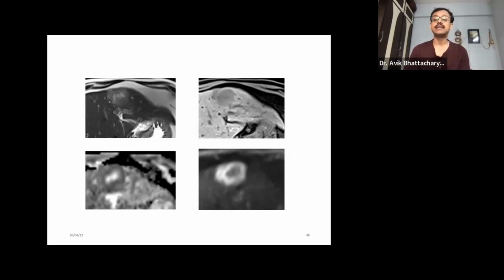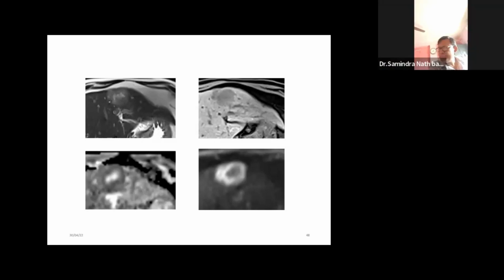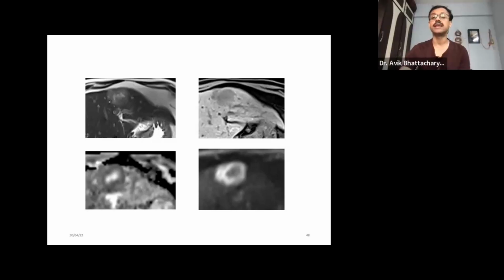Otherwise, the other stages of hepatic hydatid cyst would have different characteristic features. Like in CE1, it would have a well-defined wall, hydatid sand, dependent debris. In CE2, it would have multiple internal cystic lesions, daughter cysts. In CE3, there will be a detached curvilinear echogenic membrane inside. CE4 will be an inhomogeneous or heterogeneous soft tissue mass-like structure. Almost there is no cyst inside.